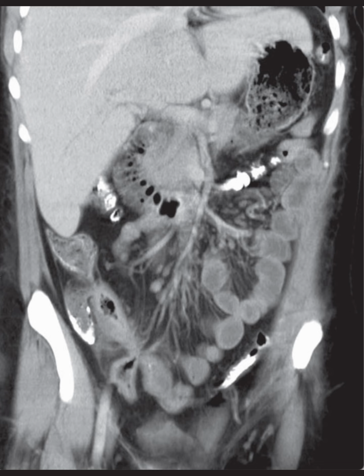Now let's talk about fistulas in the gastrointestinal tract, which can be tricky. Often, the actual fistula tract isn't visible, but we infer its presence through other features. For instance, if we see barium from a small bowel study in the sigmoid colon before the rest of the large bowel, it hints at an enterocolic fistula.